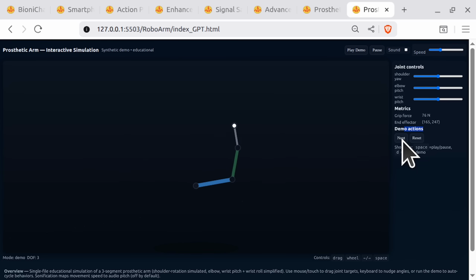So it has this one. It has a bit larger wave. Yeah, so it has these 3. It's meant to indicate at the bottom which demo action is currently playing. Yeah, something is wrong. You can control the wheel with the mouse. You also have keyboard shortcuts.